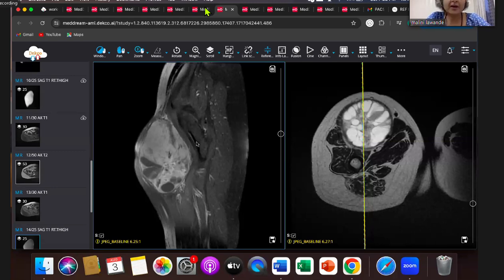The role of MR is to say that this is a soft tissue sarcoma, and then the biopsy will be done for further workup. A few things, like pleomorphic sarcoma, will show a tail-like appearance. So there can be some clues. Alveolar soft part sarcoma, small tumors, can show a lot of blood vessels. So certain things can give you a clue, but you may not be able to make a histopath diagnosis. It's perfectly fine calling these soft tissue sarcoma.